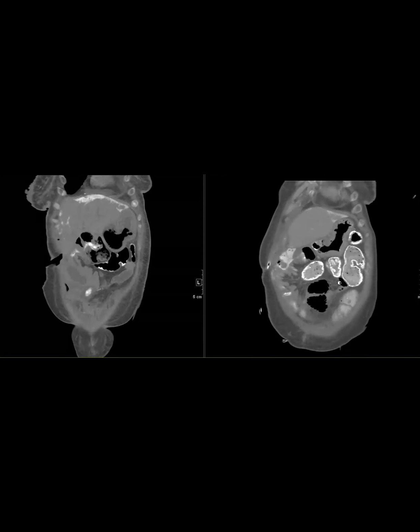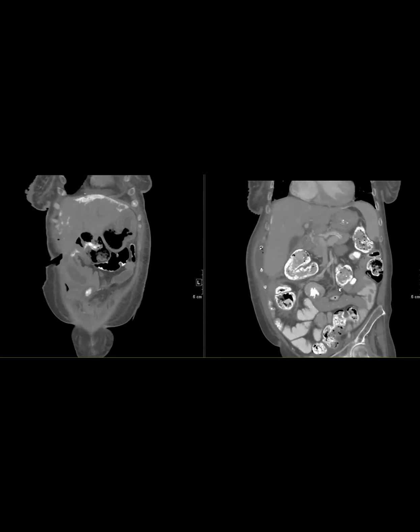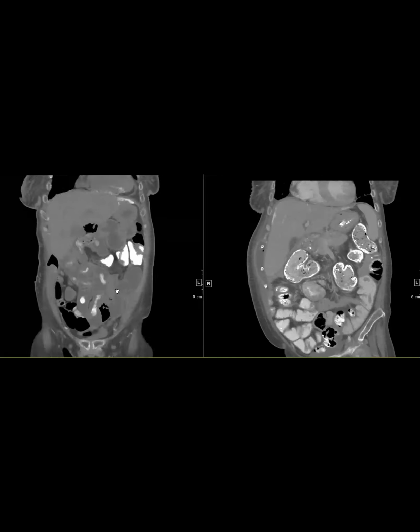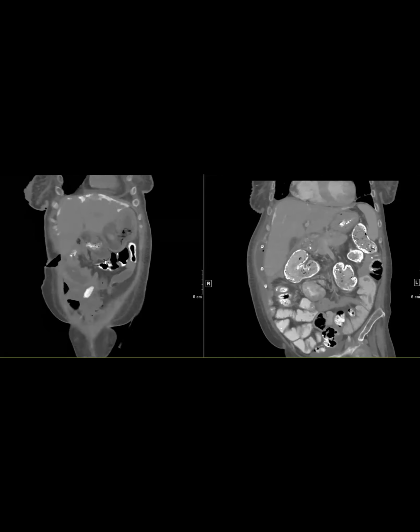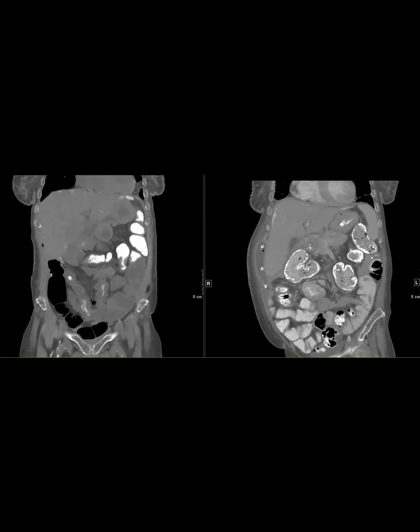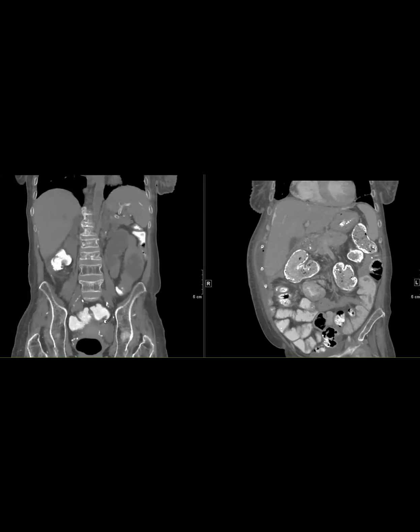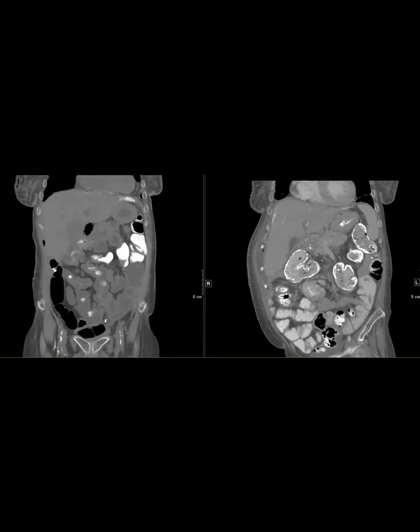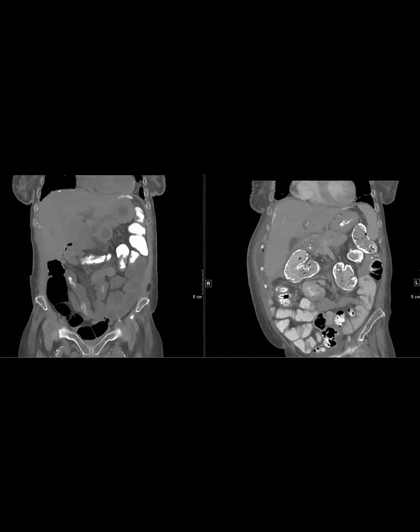Anyway, there was some contrast administered beforehand, and that's what we think happened. This was just contrast coating, because the contrast administered for this study did not reach this area. But it's coating the inside of the sock, which suggests to me that the contrast entered into the sock while the sock was still in her bowel. Yes, for sure.